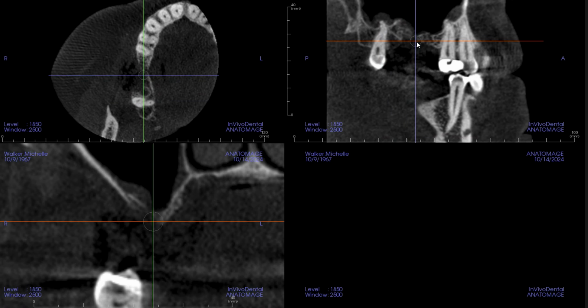But you were saying it was more on the palate. So we're looking up in this area here for some signs of issues. A tentative diagnosis of an OAC causing palatal swelling, on the surface, gives me a little bit of pause. So I want to explore a little bit more to try to get a sense of what might be going on. Now, what we did see is a root that communicated or came in close proximity to number 1. So this being number 1.